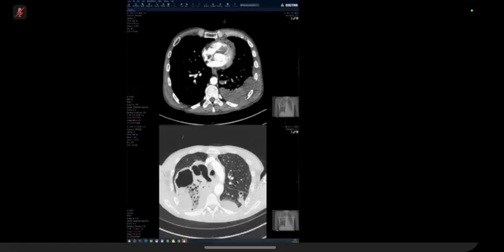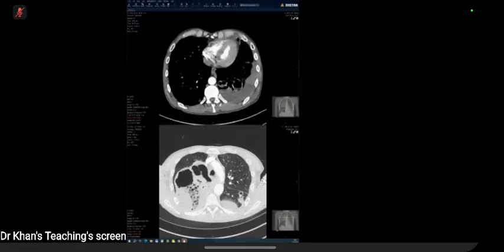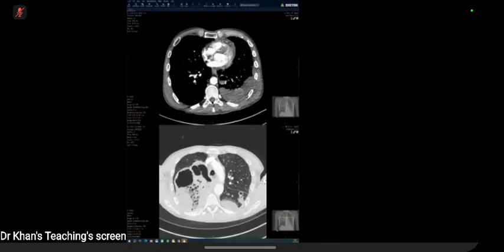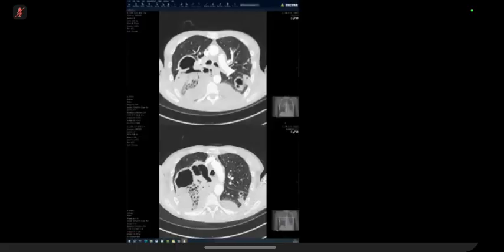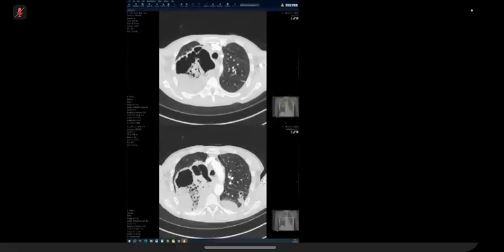So this is pleural effusion with multiple cavity lesions in the lung. The potential diagnosis may be multifocal pneumonia, multiple lung abscesses, multiple septic emboli with flaring of inflammation in the lung. So this large lesion, is this an empyema or is this a lung abscess?